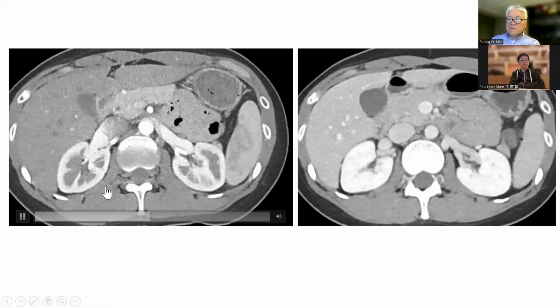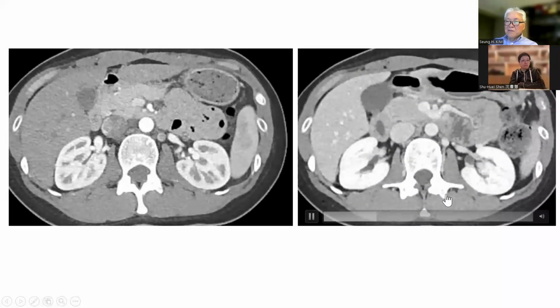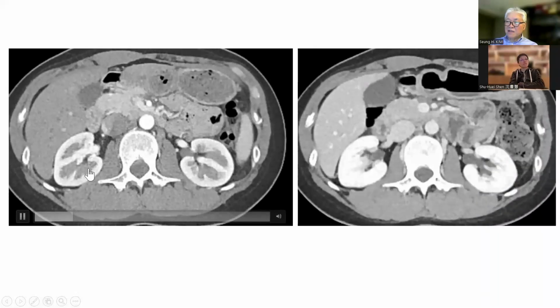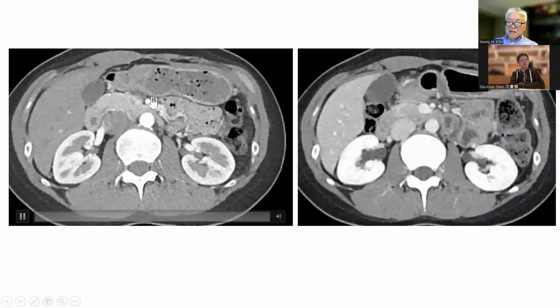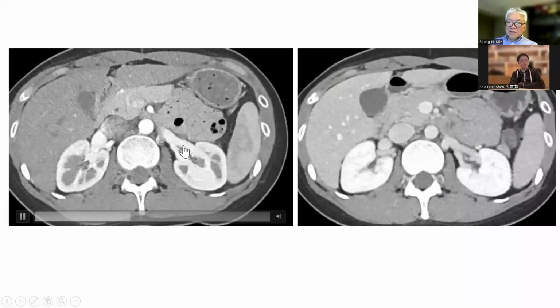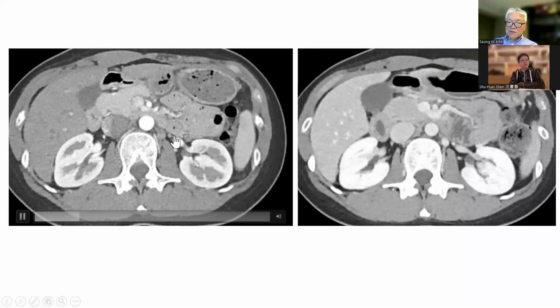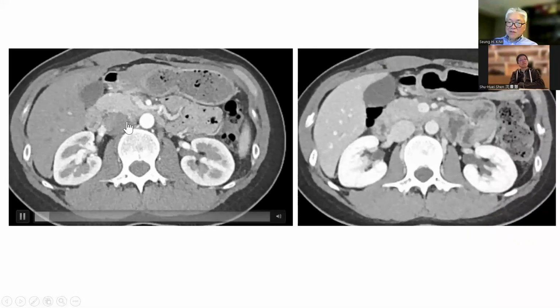And sometimes, not with a well-done kidney CT but with a routine abdominal CT, we do not have this early phase contrast-enhanced imaging. In this early phase CT scan, we can clearly see the movement of contrast opacified blood along the left renal vein.